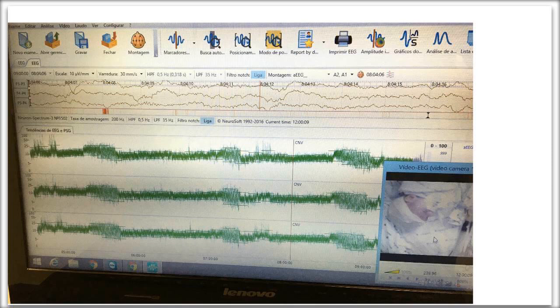So these are some really great tracings. I think it illuminates some of the common questions. We monitor and then there are these very different tracings that pop up for us, and I think it's good to share them and to have a short discussion about them, and even just to validate what you're thinking and feeling in your own practice. So thank you, everyone, for offering to share these with us.